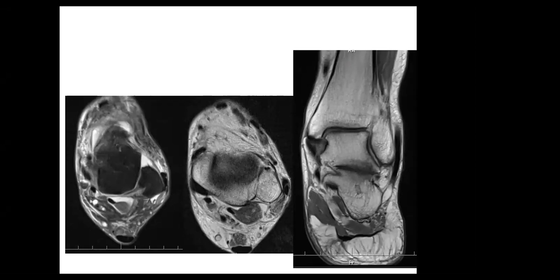Do you know why I moved the image? Excuse me, professor, what is it? I've just moved this image a little bit. So, okay. Are you done with the case or are you still working? Finished.